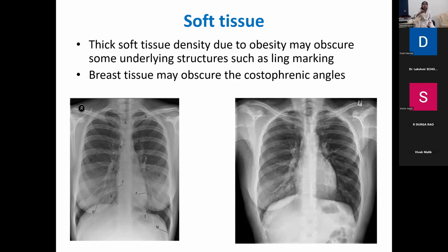The only step you have to do is auscultate the patient, and make sure that it is just breast tissue and nothing else. If you clinically examine the patient, most of these X-rays you can interpret yourself. So you are seeing here the breast shadows. Here there is a breast shadow on the right, but the breast shadow on the left is not there. So this is a case of left mastectomy.